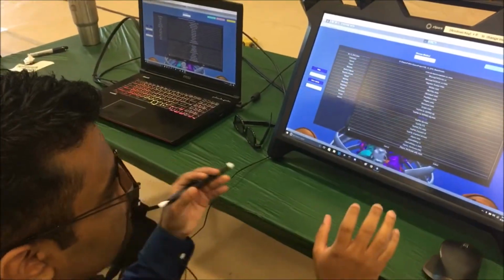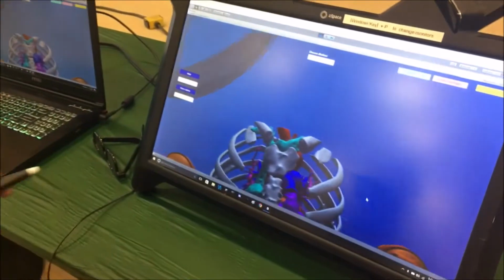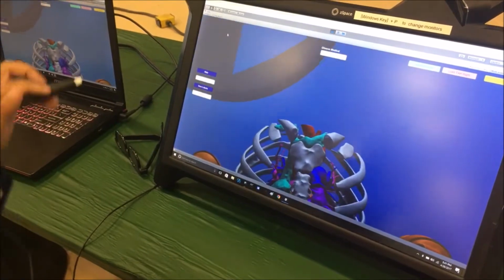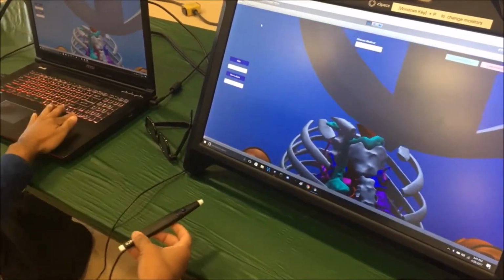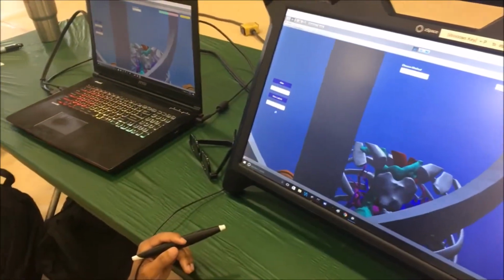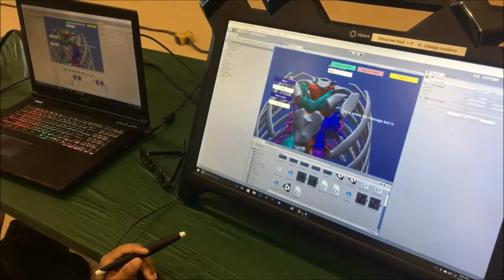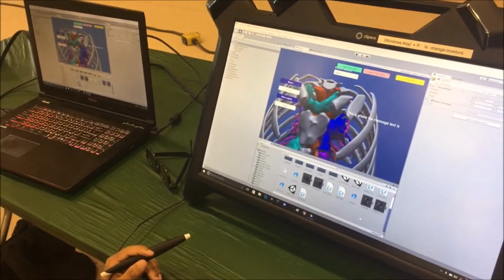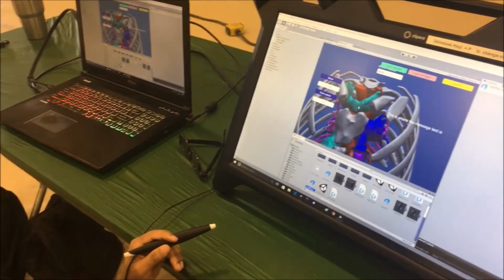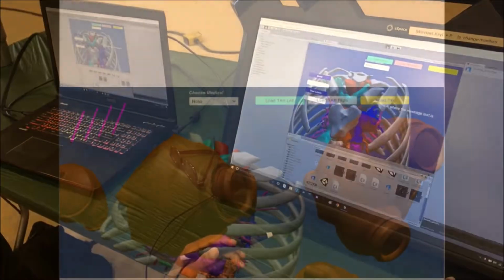So we can also import OBJ files as well as STL files. Once we click select for an OBJ file, if we make a change to the OBJ file, we can go ahead and export it so that the change is seen in the other environment that the clinician uses. So once we click on export, we'll be able to see this file called testfile_exported.stl, which is the exported file of the object imported at the moment.